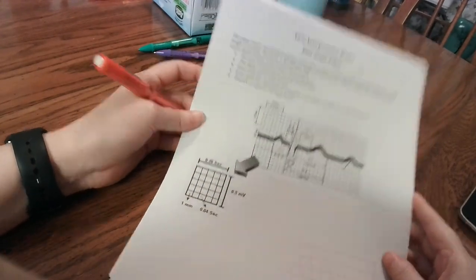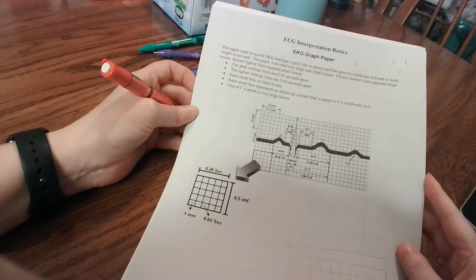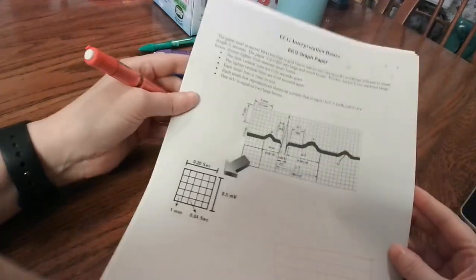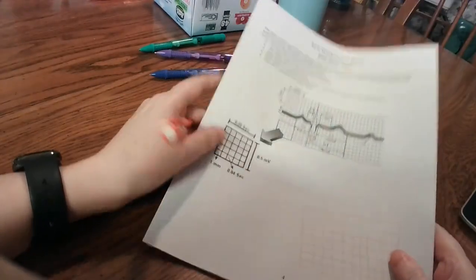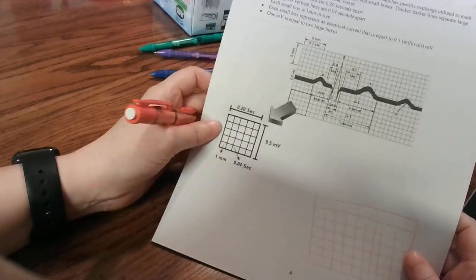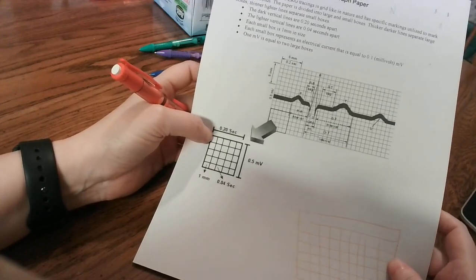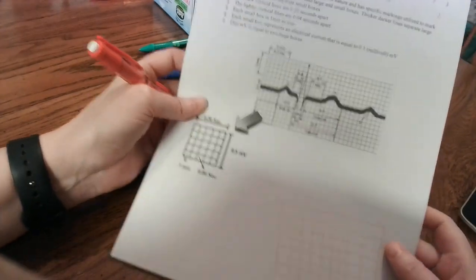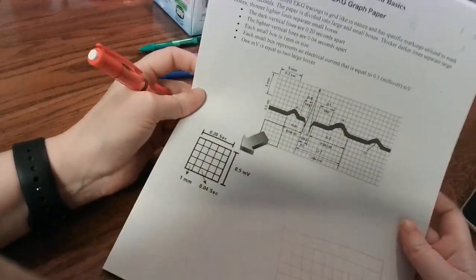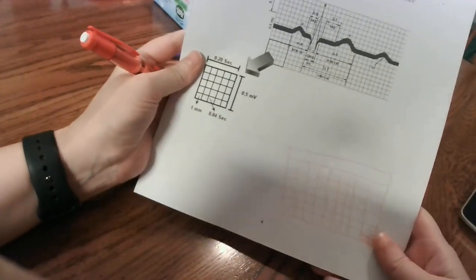First, I'm just going to go over the basics of how to read an EKG, and then I think I'm probably going to make several smaller videos so that people can just see the things that they need to see. I found a PowerPoint online about all of it and printed pages from it. So I'll try to remember to post that link to wherever I found it after I do this. Anywho, this is the basics, the first things you have to learn whenever you're doing an EKG. And I made a little drawing down here in the corner.